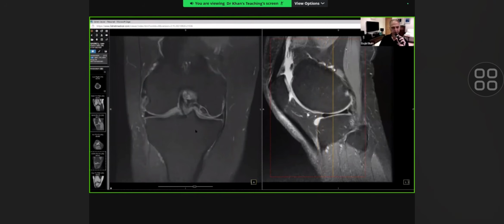We can see that there is a big osteochondral injury present on the medial weight-bearing surface of the medial femoral condyle here. The bone fragment, when you see that, that's the classical location of osteochondral injury of the femoral condyle, present on the medial femoral condyle, weight-bearing surface. The good signs here are that the overlying cartilage appears to be intact. Number two, the deep cleft that we have is bright signal, but it's not very wide. And there is no subchondral bone marrow edema present.